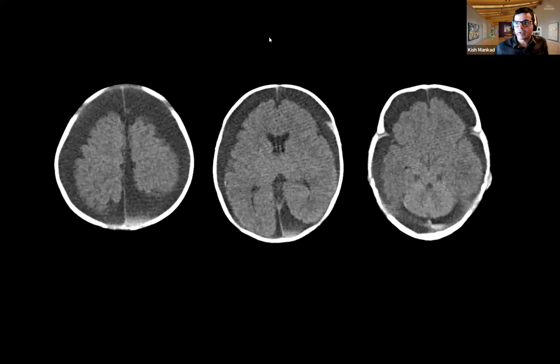What is the scenario that we are talking about here? So you might get only this in the context of a child who is encephalopathic or not. They may not always be encephalopathic, but I'm expecting the kid to at least have some seizures here because they have a lot of mass effect on the brain. And you have bilateral mixed density subdural effusions in multiple compartments, at least in the front and in the back. What do you think might be the first diagnosis in a child who is under 2 years of age? So, child under two, unexplained subdurals.